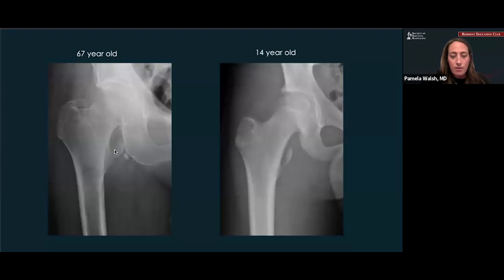So this is the case we had. So here's that avulsion fracture of the lesser trochanter. So we see this case, and then I just want to show you a young patient that still has apophyses. So we see this avulsion, and that's going to be of our iliopsoas in our 14-year-old with a sports injury where the iliopsoas kind of rips off the apophysis.